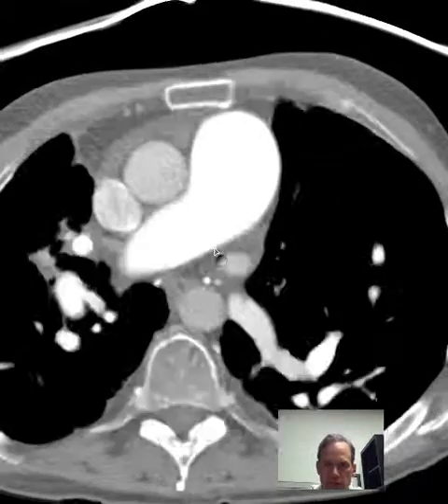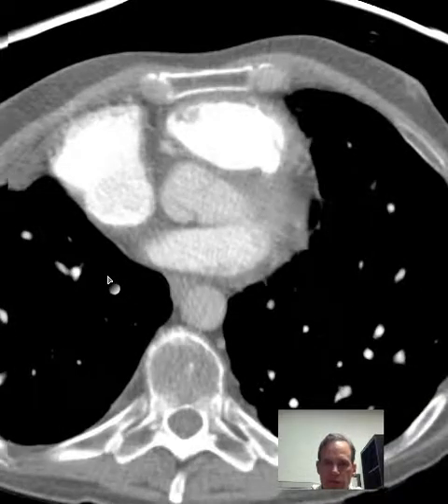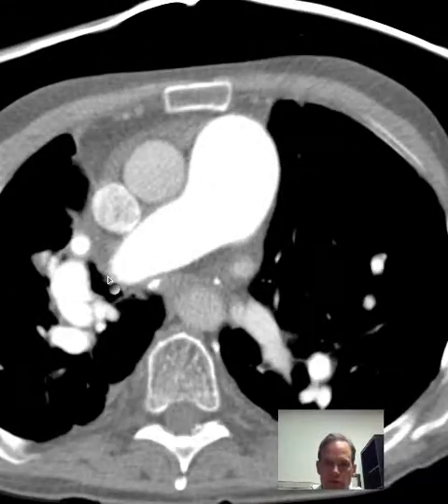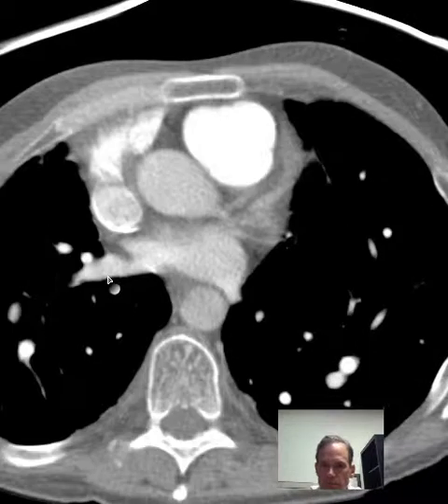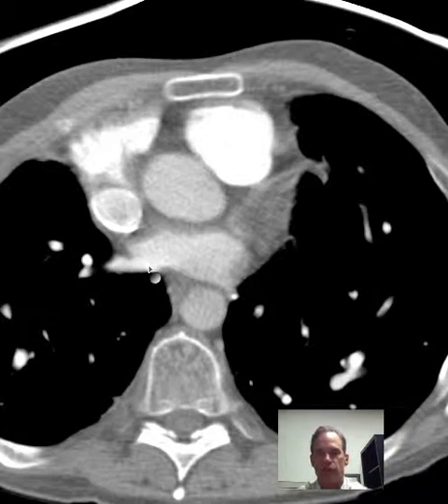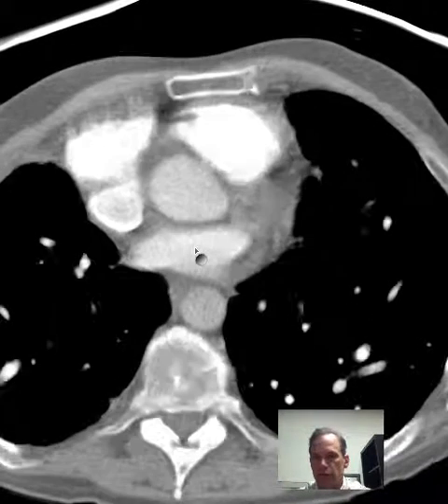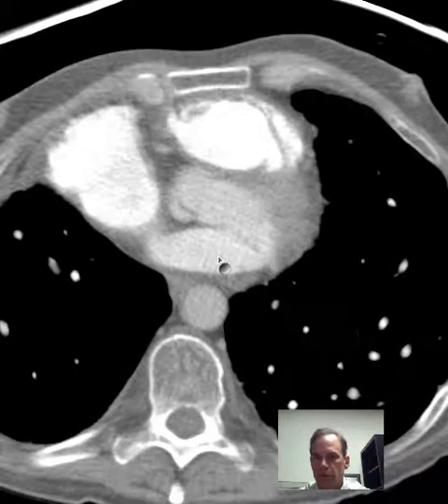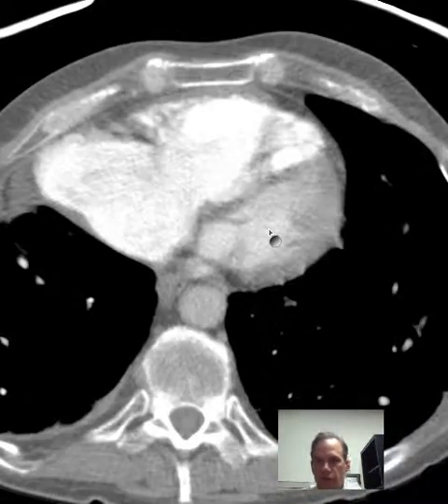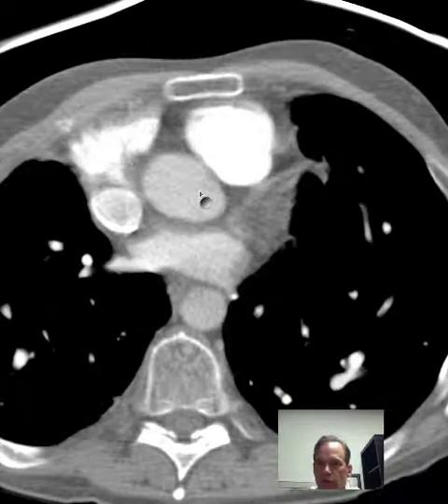And on the right, you also have a vessel here, that goes into the left atrium with its newly oxygenated blood to go from the left atrium into the left ventricle and then out the aorta.